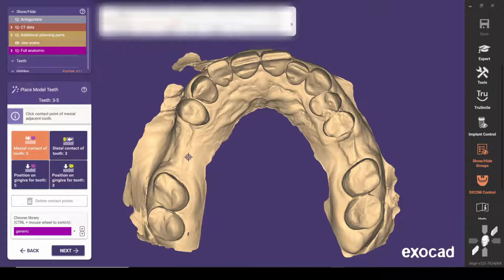This is not the full version of the placing of model teeth. So I think if you really need to do a more comprehensive wax up initially, the first step is to do that in ExoCAD and then bring that in as a pre-op into ExoPLAN. And then align your implants, you know, from a crown down type of philosophy or restoratively driven philosophy, align that from your pre-op diagnostic model or diagnostic wax up.